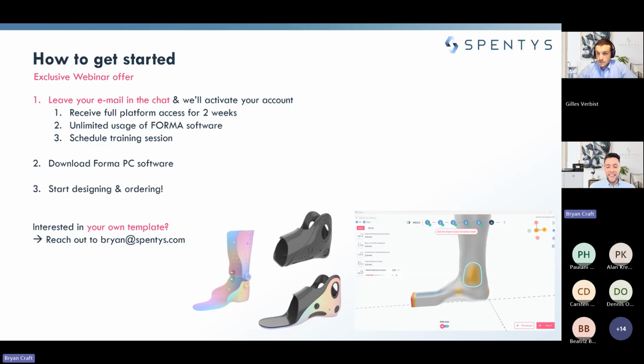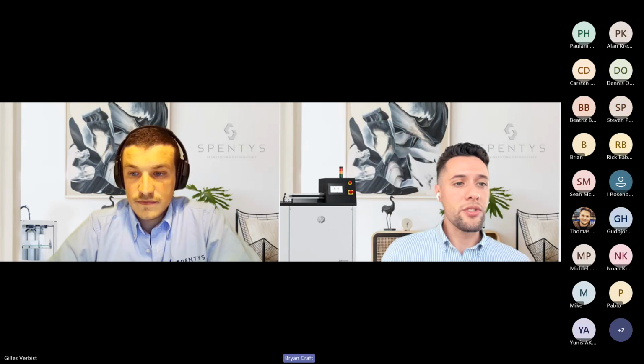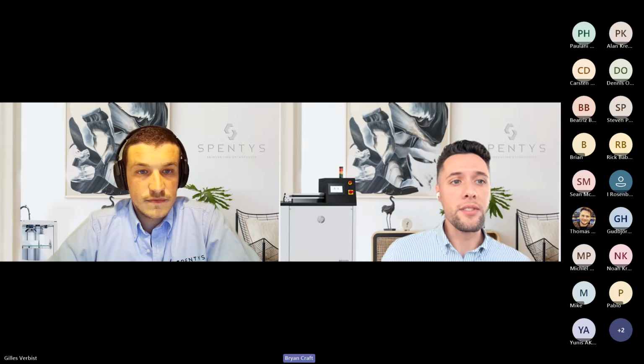So that is footForma, and like I mentioned at the beginning, I'm thrilled to introduce it to you. We first launched this software back in June of last year, and it's gone through a series of impressive updates. So what you're seeing today is a labor of love, and we will continue to optimize it and make it amazing. So with all that being said, if there are any questions, let's just jump right into them and go from there.